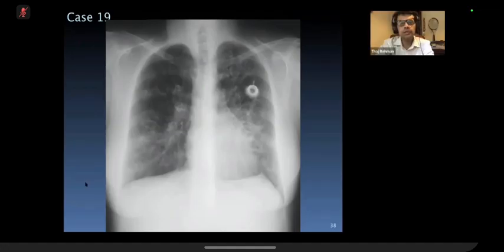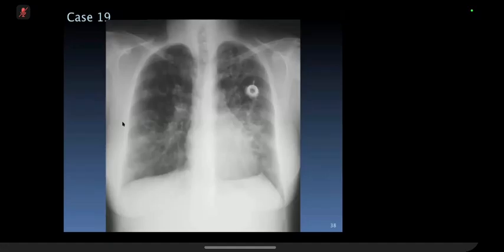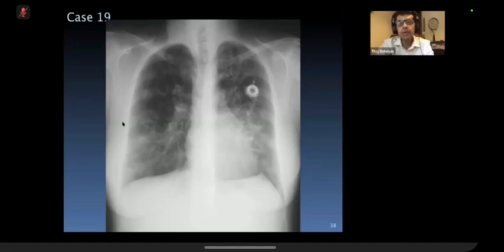Yeah, cystic fibrosis is the pathological diagnosis, but the appearance on X-ray, you can say cystic bronchiectasis. The reason why you use cystic bronchiectasis is it connotes a more advanced phase of bronchiectasis. It's a later phase where the bronchi are so dilated they appear like big cysts. So you can say cystic bronchiectasis, and most commonly in a young patient of this age, cystic fibrosis is the likely diagnosis.